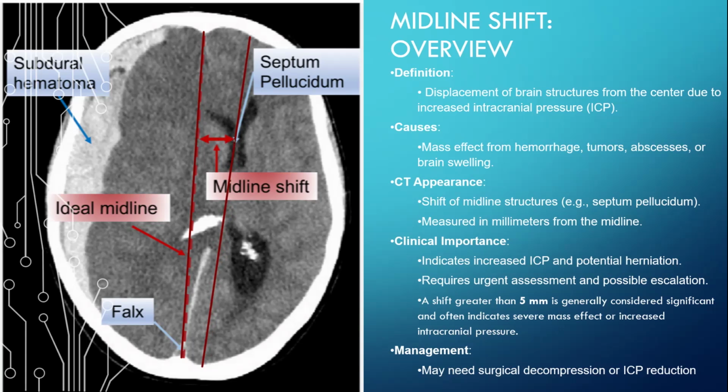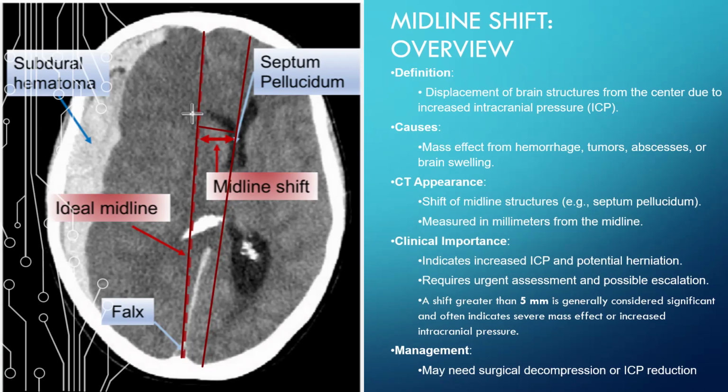So this is not 100%. You'd sort of measure it like that. I hope I've got that right, Shina. If I've got it wrong, more than welcome to correct me. I don't mind. It's really not a problem because you would have done this a lot more than I would have. But that's basically how you work it out. And then you measure that in millimeters.